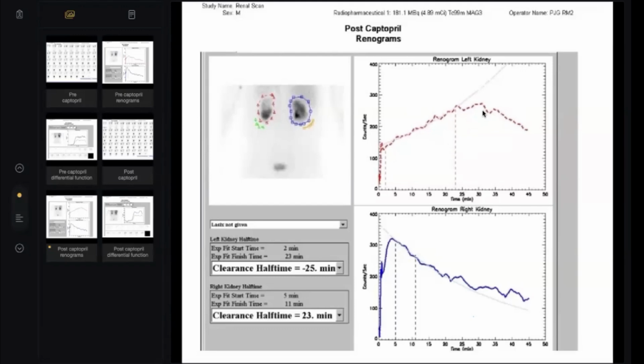Yes or no? Yes. So are we on the renal artery stenosis pathway or not? Yes. Sure. What happened to us? Increased excretion. No, no. This is excretion, doctor. See? This is uptake. This is time to peak, the maximum uptake.